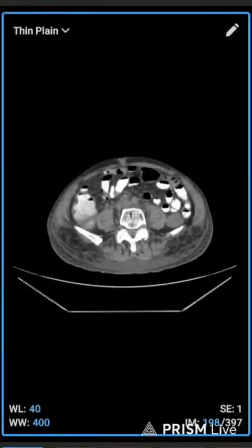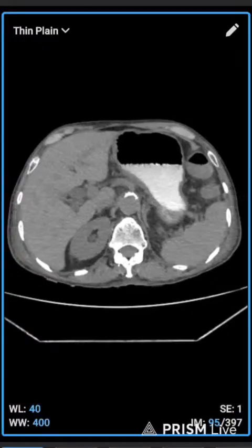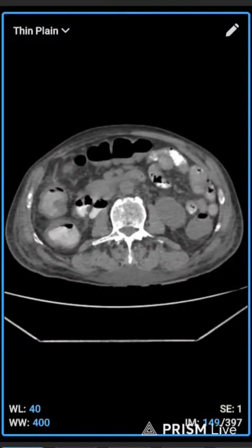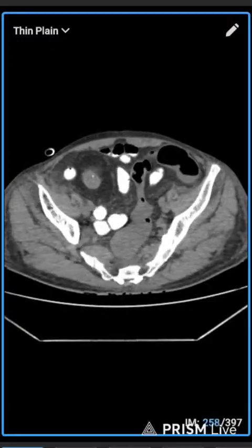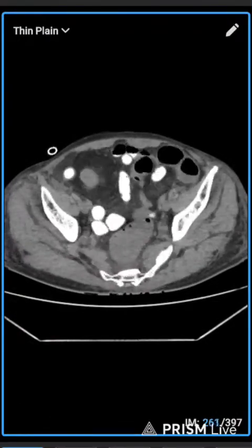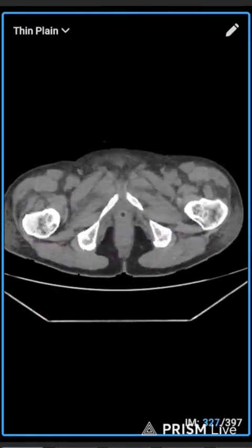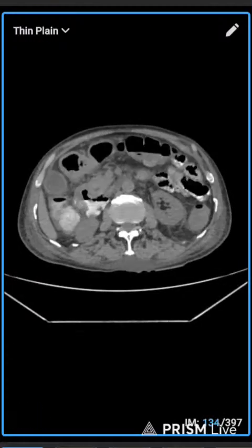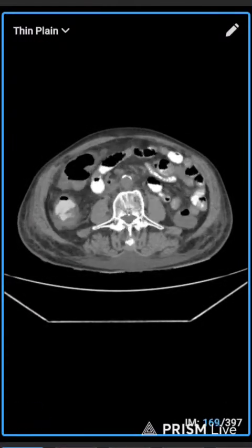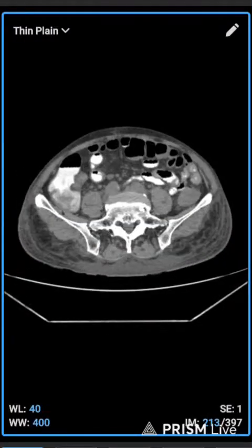Here you can see the plain scan of abdomen. You will find out we give the patient oral contrast. We prepared oral contrast about 45 minutes before the scan. This is the 45 minutes after scan. We will find out properly because of the positive oral contrast. The plain sequence was visualized. The problem of the ascending colon.